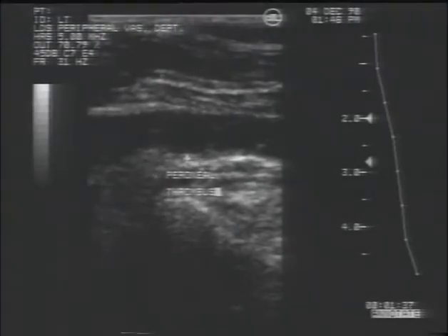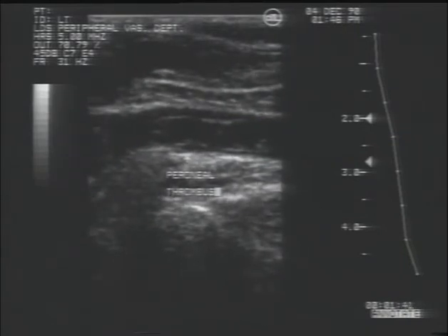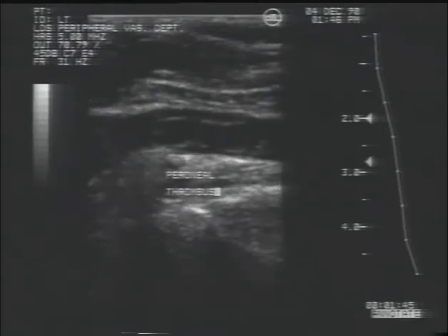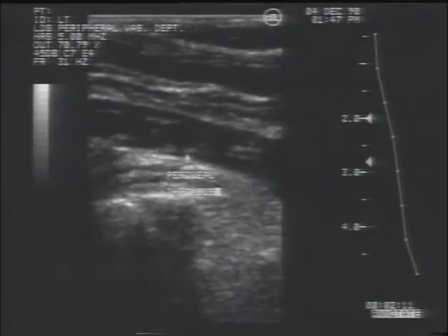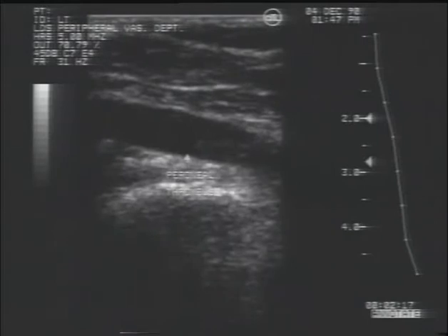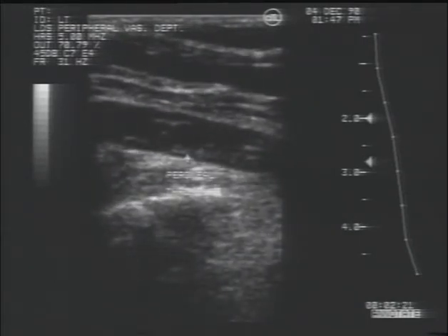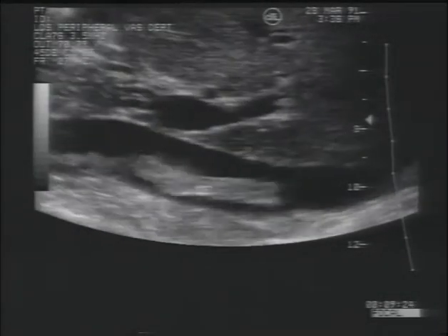As a general rule, the newer the thrombus, the more lightly echogenic it appears on the screen. Some clots are nearly invisible when they first form and would be missed on ultrasonographic examination if not for the fact that the invisible thrombus prevents the vein from completely collapsing. As time passes, the thrombus becomes more dense and the echoes can be more readily observed. When new thrombus forms, it attaches to the vein wall.